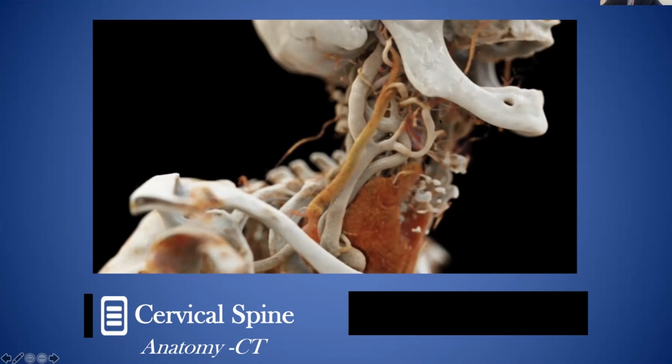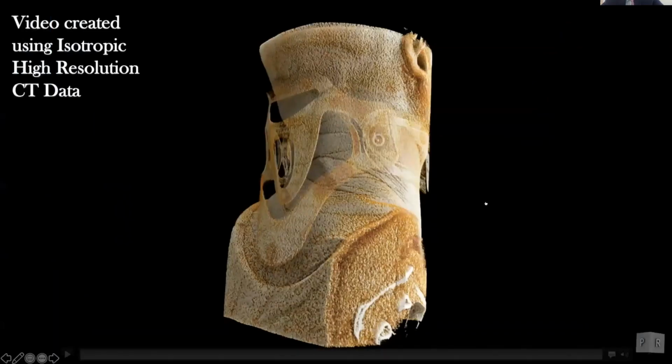So again, cinematic rendering, I think, is particularly useful for understanding anatomy. I think we're moving progressively towards an era where we're able to visualize things reliably in 3 dimensions with exceptional granularity, and we're also able to see with relative perspective where various structures lie adjacent to one another in terms of depth and position.